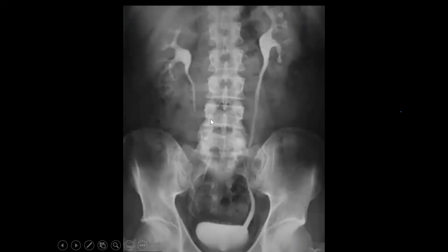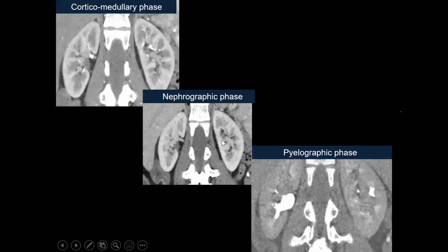This is another example where, rather than widening of the kidney, the ureters are closely located. They are medially deviated. So this is the normal place, but here it is medially deviated. They should follow the transverse process, but in the lower part they are quite medial and very closely located at the level of the sacrum, and then again go laterally. This is called the maiden waist sign. Maiden waist sign is seen in retroperitoneal fibrosis. So this is what I was telling about IVP.